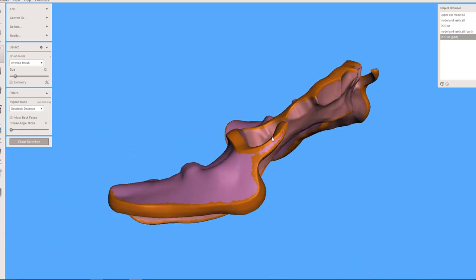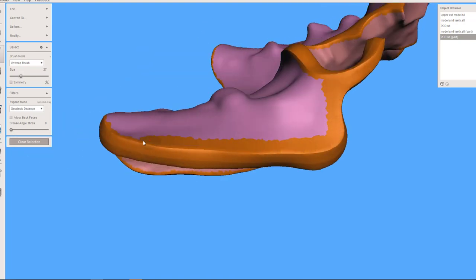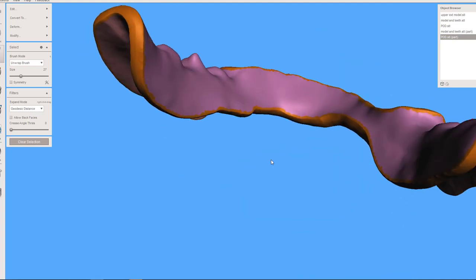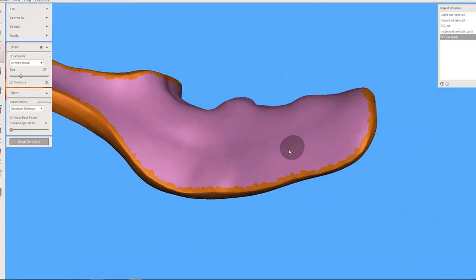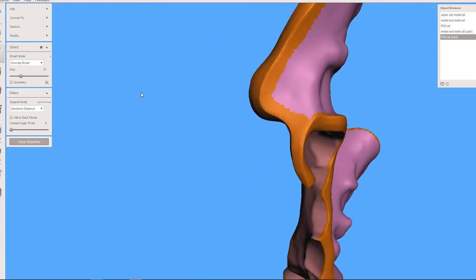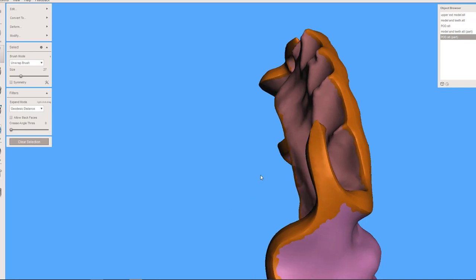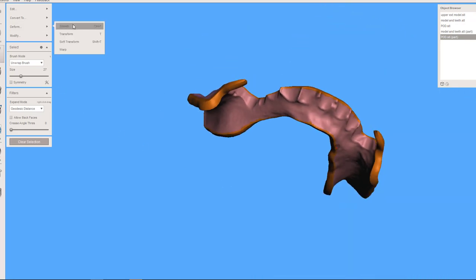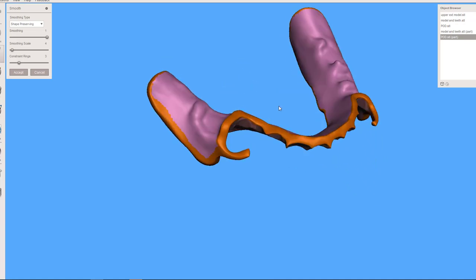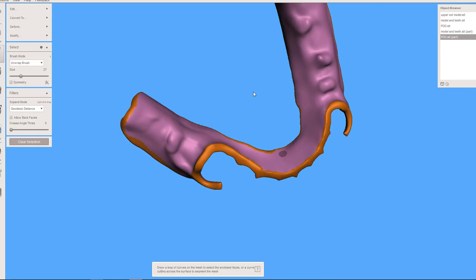All of these tools, right after you use them, that surface is still going to be selected. So you could do some other stuff while it's selected, like maybe you wanted to smooth the boundary, not the triangles, but actually smooth the mesh itself. So I've selected both of those clasps because I want to smooth off their contour. There we go. And then go to deform and smooth. Doesn't have a huge effect, but it does smooth things out just a little bit. So I've accepted that now.